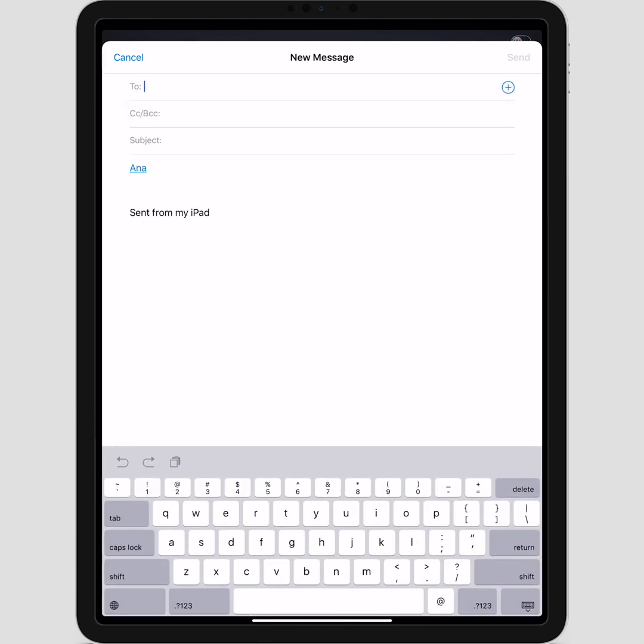So DSDApp will send the complete documentation you created, including the pictures, intraoral scanners, and CBCT, within a zip file. And it's very simple to open it once you receive it.